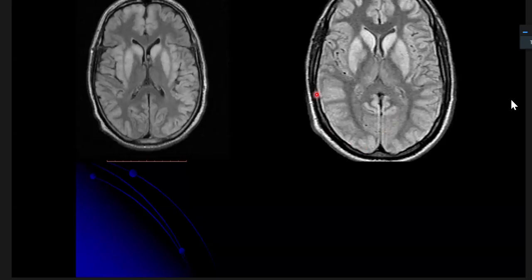Okay, sir. So, simple points: cortical restricted diffusion and cortical swelling in adults with preservation of the occipital lobes and perirolandic region favors hepatic encephalopathy.